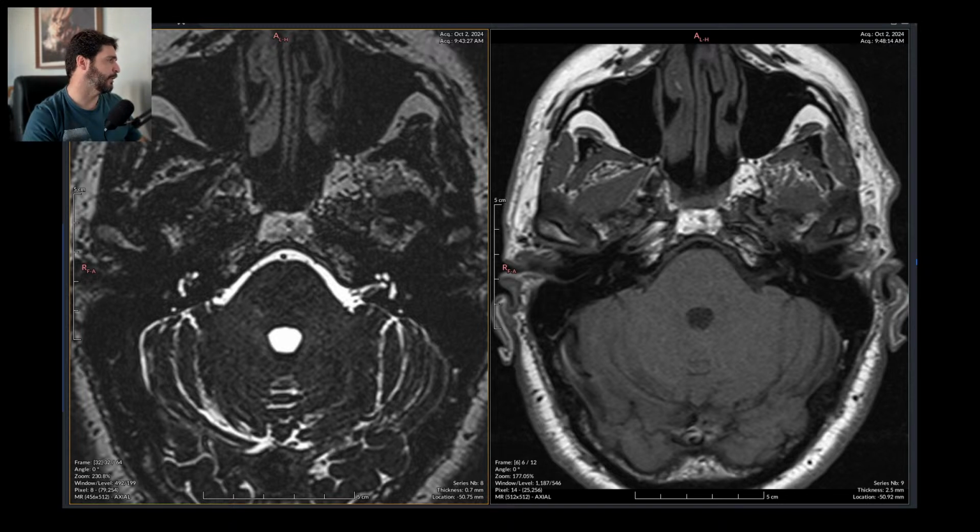I'm just going to grab my template. I have a template for this, of course. And I'll be on my way. And we are done with this crappy scan.